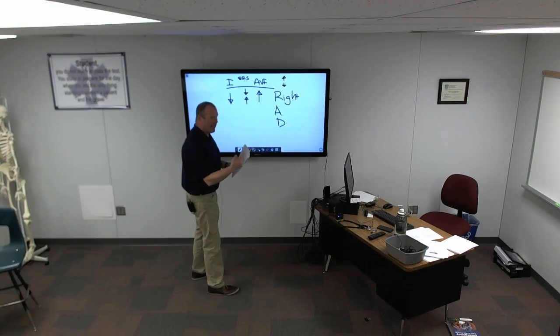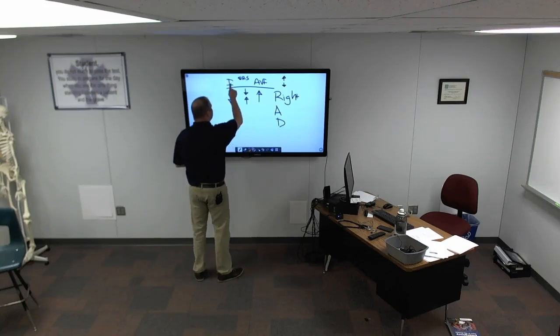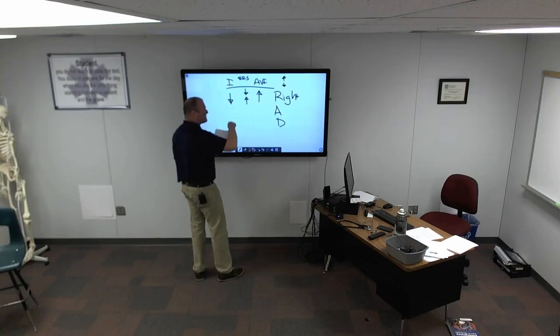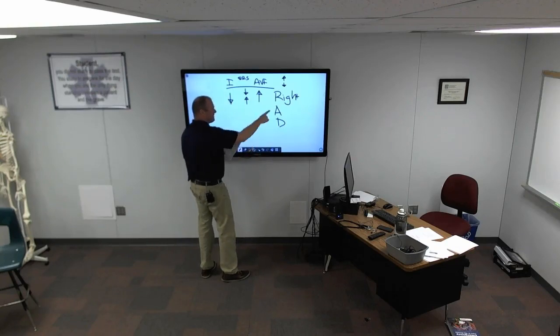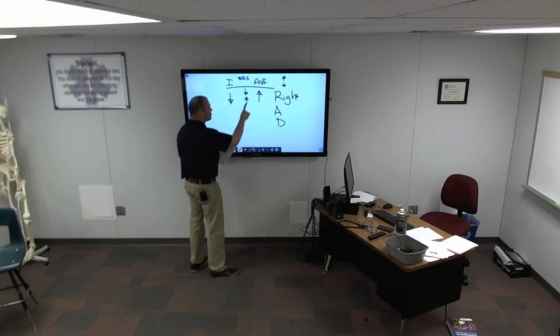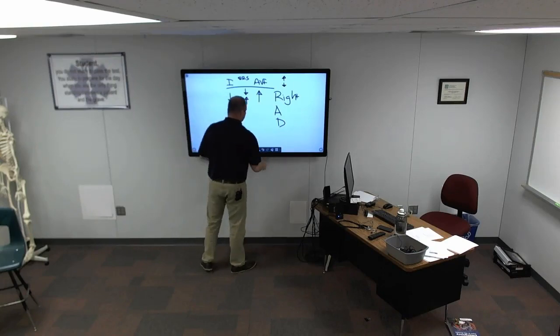Once again, we talked about hypertrophy. We also talked about infarction. So we've got right axis deviation. If in lead 1, your QRS is negative, and in lead AVF, your QRS is positive, that is right axis deviation because these two are headed right at each other.